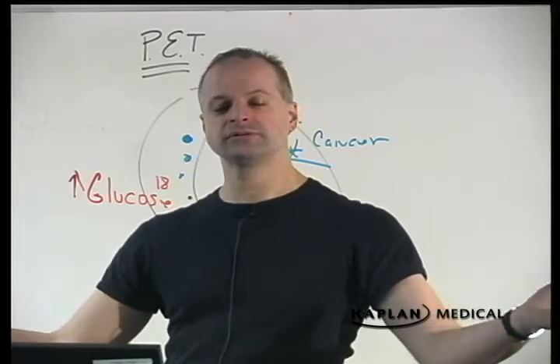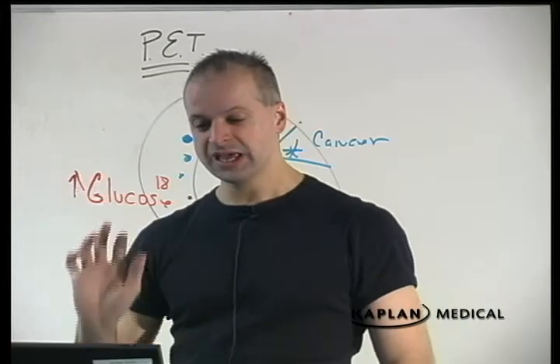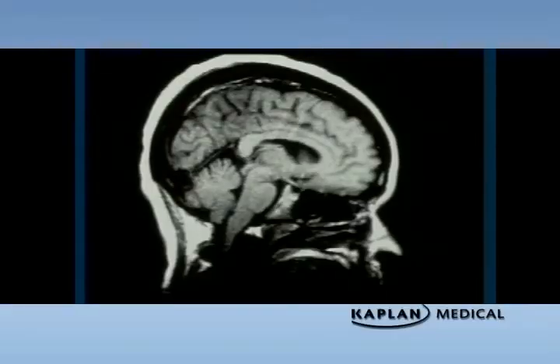Om Namah Shivaya. Next. This is a normal MRI of the brain. This is your cerebellum. This is the fourth ventricle. This is the corpus callosum. This is the normal brain. That's my nose. That's my pharynx. Pharynx, sinuses. This is the pons and your medulla oblongata and your brain stem. Cerebellum, normal brain, corpus callosum, ventricles, pons, brainstem.